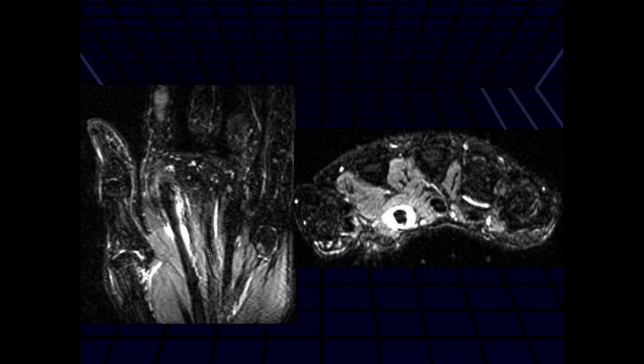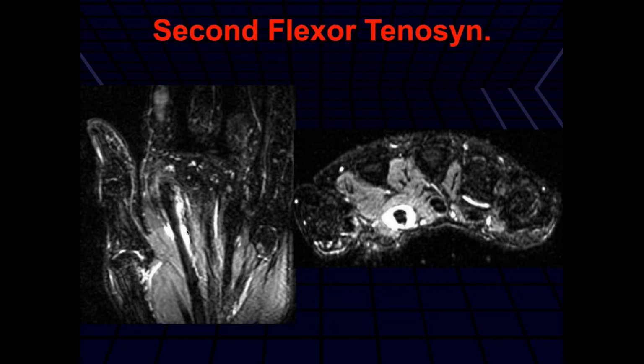I'm seeing increased signal around the flexor tendon on the second digit there. Some tenosynovitis of the flexor tendon.